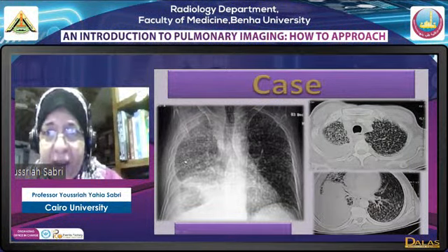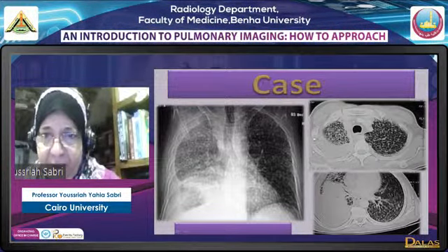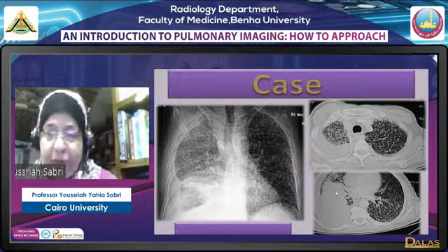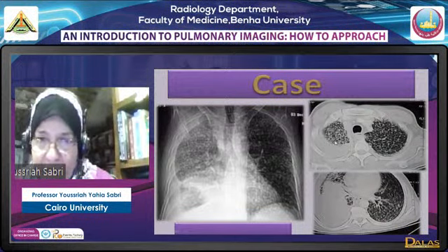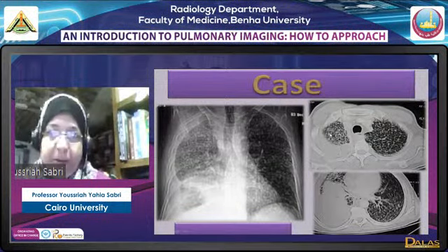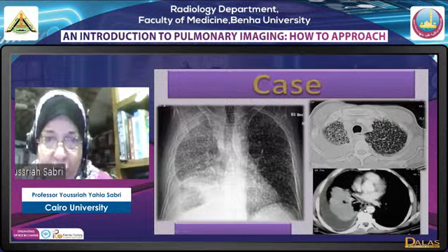This was actually a case of miliary tuberculosis. In addition to the miliary shadows, we have the effusion and we have a consolidation here. Now, mind you, with this effusion in the supine position, the margin of the effusion is parallel to the rib. And this means I'm dealing with a free effusion. It is exactly parallel to the concavity of the ribs where it is present. This is effusion. Multimorphic lesions, where more than one lesion is present, suggest tuberculosis.